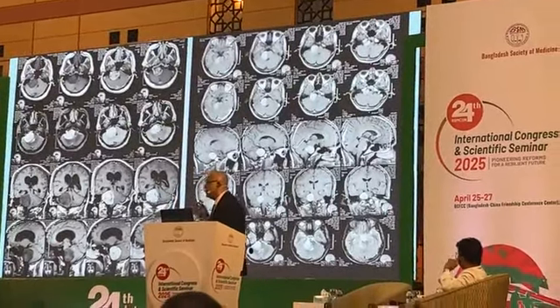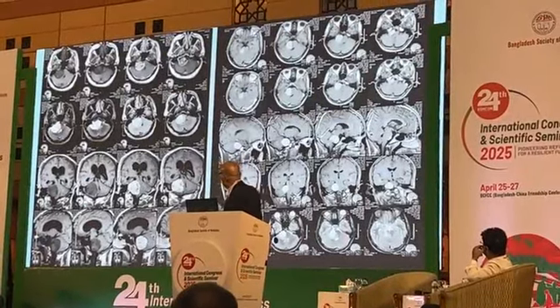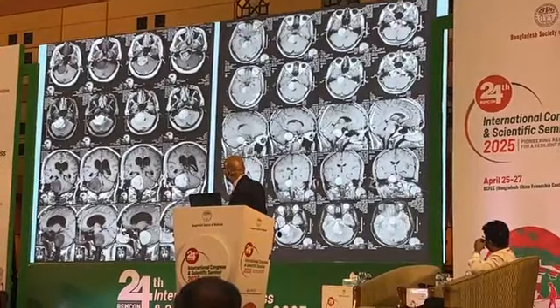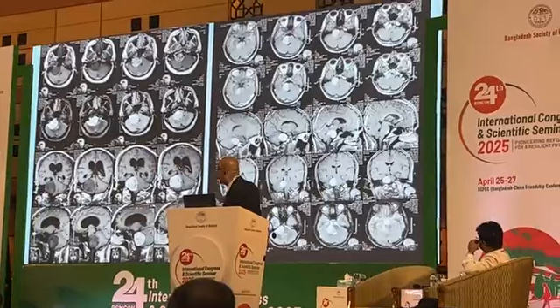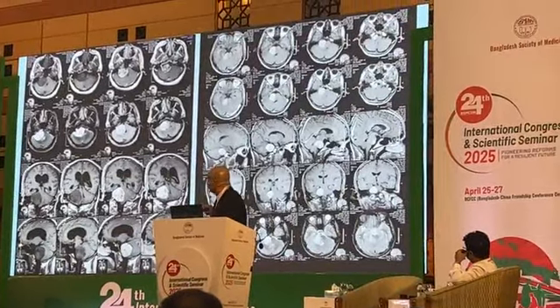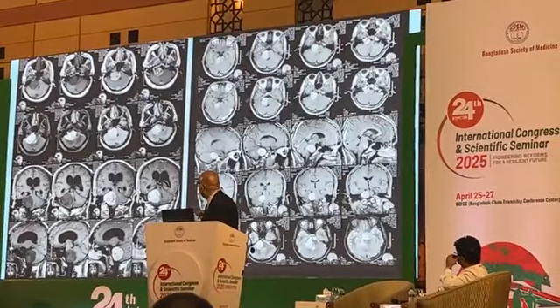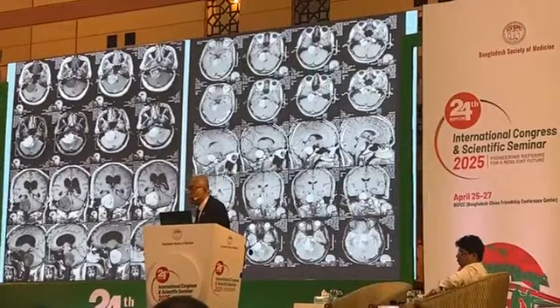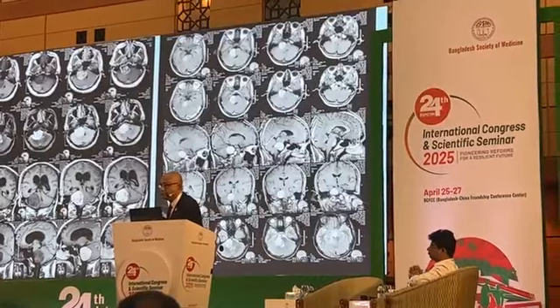And we can predict or presume which one this is from just its appearance. Can you see there is an angle, there is a conical projection on the right border of this lesion. This is called ice cream cone appearance, like an inverted ice cream cone. If you can see this angle or projection or ice cream cone appearance, this is very likely to be acoustic neuroma.